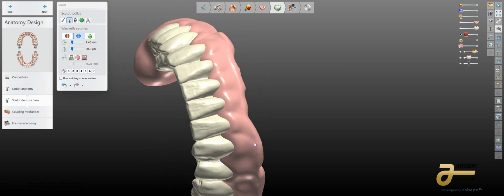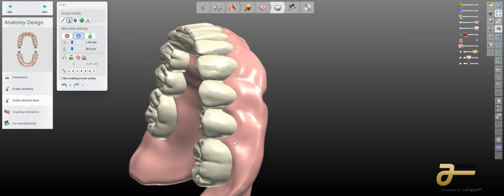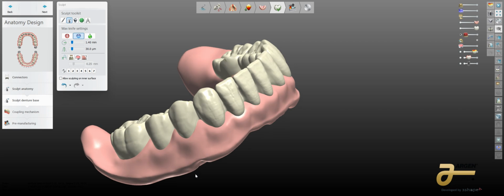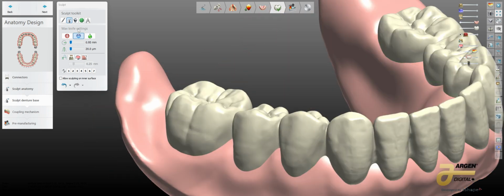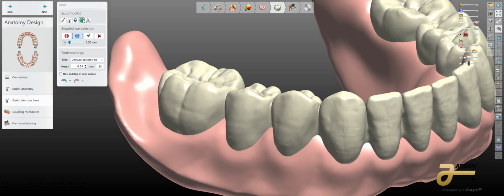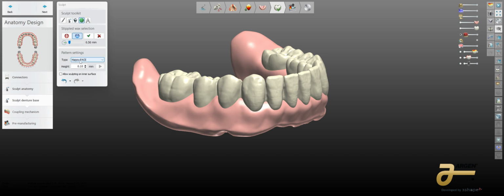Just really quickly, smoothly. Again, less is more a lot of times on these cases. And there's tons of different features to add stipple in and do all that stuff. I don't like that stuff, but I've made a lot of my own stuff in here to be able to do some fun stuff. You know, even little happy face stipple. So I won't show that.